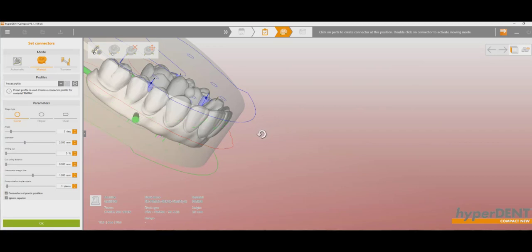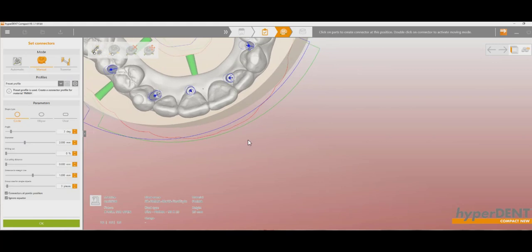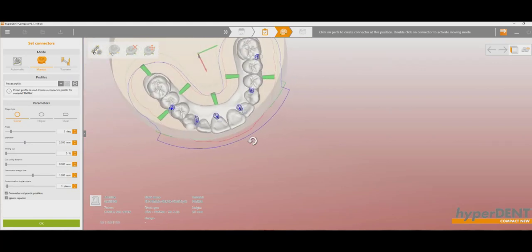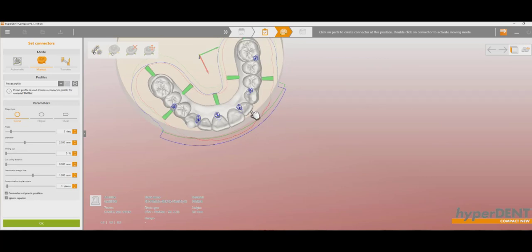One here. Now we're just going to rotate it, look at it from the top to make sure that those are inside, you know, that they're going to be inside where they're still attached to the disc on the outside. So you wouldn't want to put one here because it would just be floating in space.